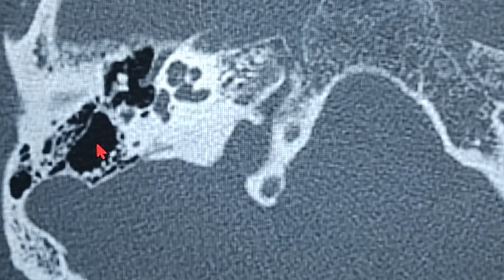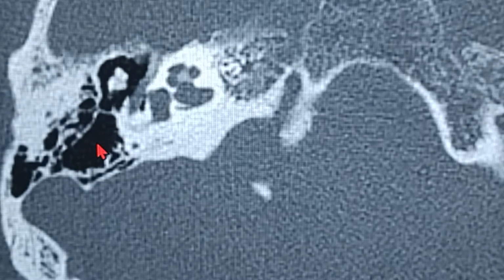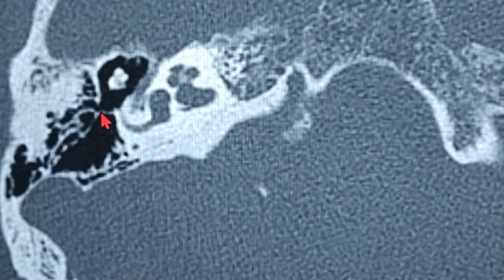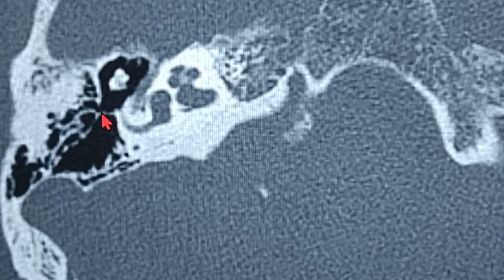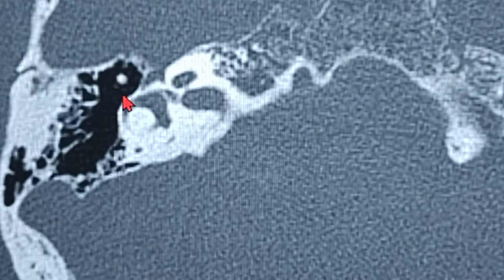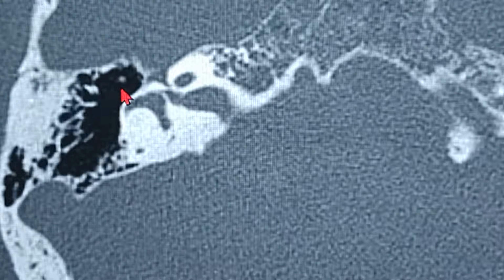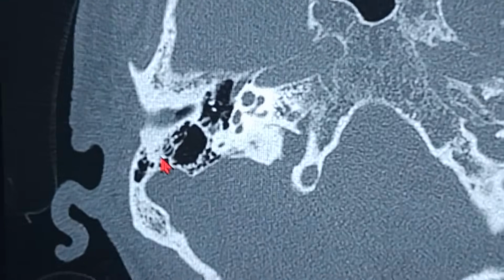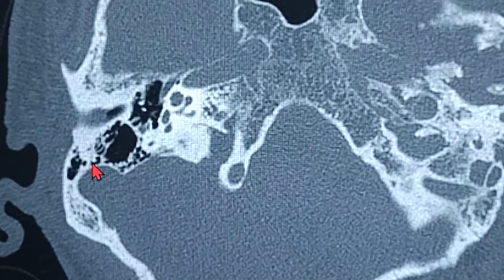That's the antrum, and if we still keep on going above, you can see the mastoid air cells, and the tegmen tympani and the tegmen mastoideum I'll show you much better on the coronal scan. Okay, so this was the anatomy of the ossicles basically. Now I'm going to show you the anatomy of the facial nerve. Now let me just zoom this out.